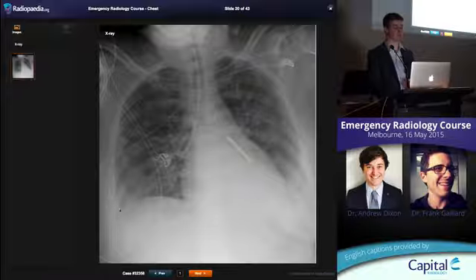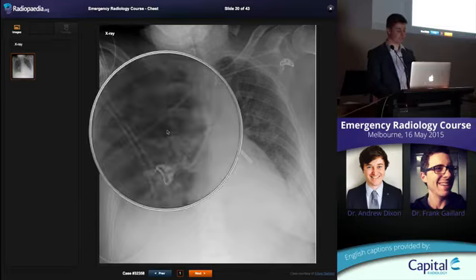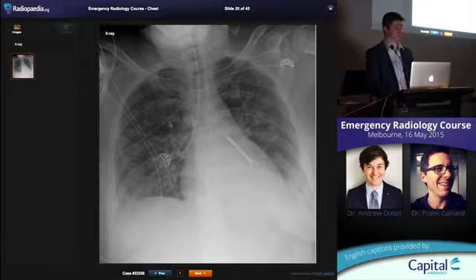This patient's got some density out in their costophrenic recesses, and they've got what we'd call venous congestion. These are all vessels that we're tracing here. Okay, they're just a little bit more prominent than most people. They may be supine, and that can be normal. If they're standing erect and they've still got these prominent vessels like this, then that would be venous congestion, a sign of fluid overload.